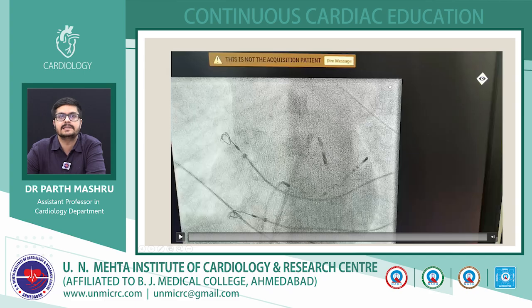If you can imagine the ECG leads over here, AVL is somewhere over here, lead 1 is somewhere over here, and 2, 3, AVF are on the posterior region. So the accessory pathway was found to be over here, which correlates with lead AVL, and you can correlate this in the ECG also: maximum negativity was there in AVL, lead 1 was biphasic, 2, 3, AVF were positive, and V1 was positive, so it was left sided.